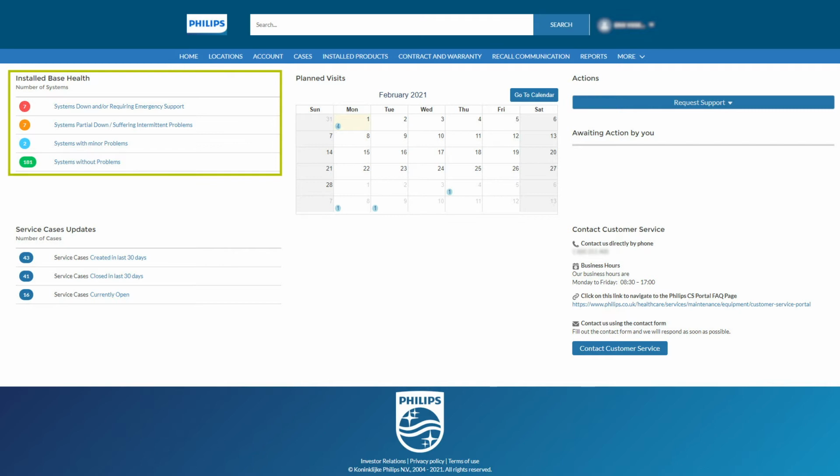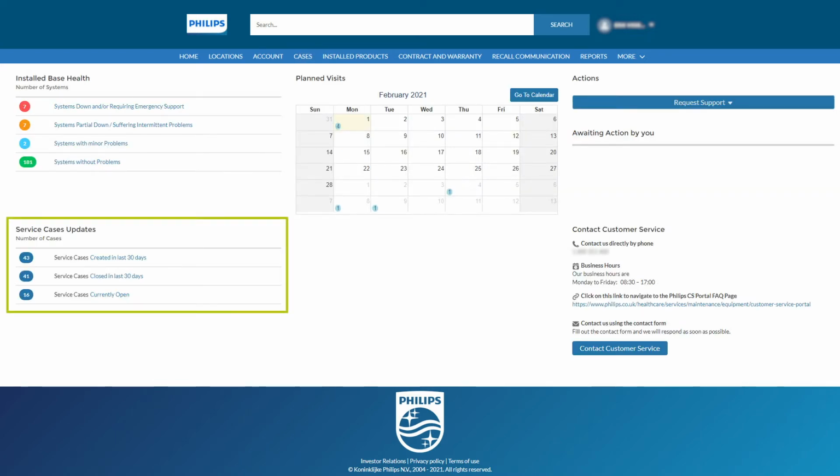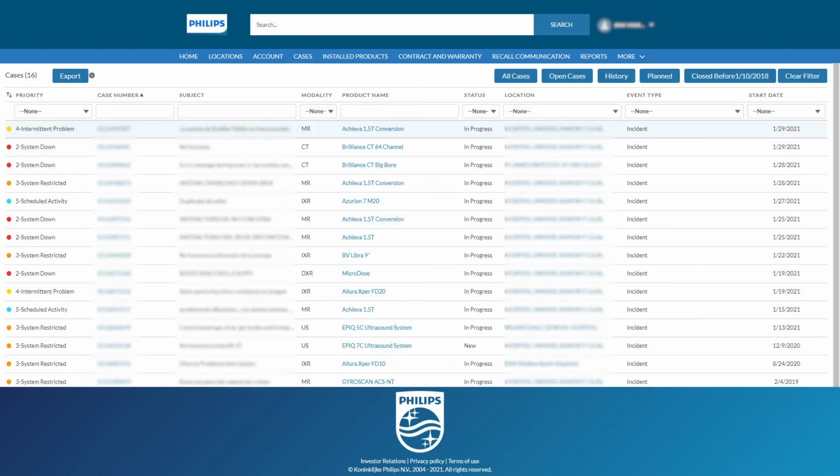Installed Base Health gives you a quick overview of the number of installed products with open incidents by case priority. You can click the link to view the list of incidents. Service Case Updates provides an instant overview of the number of cases created in the last 30 days, closed in that time, or currently open. Click the link to see the list of these cases.